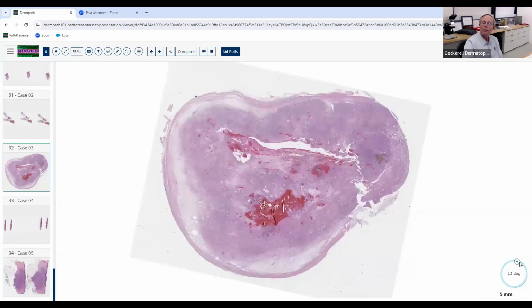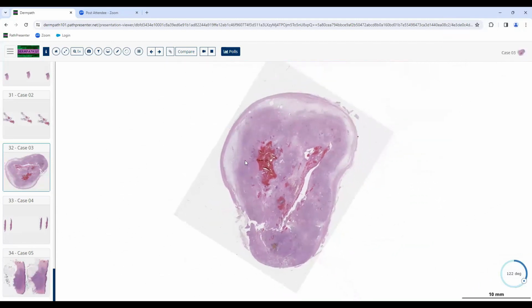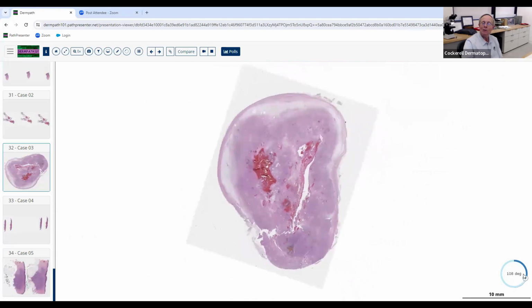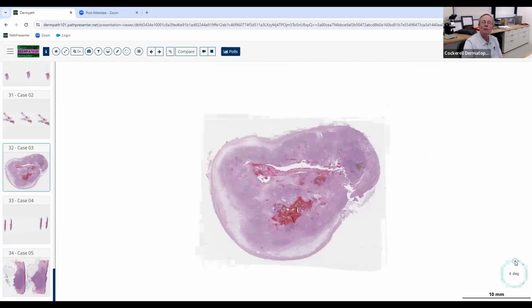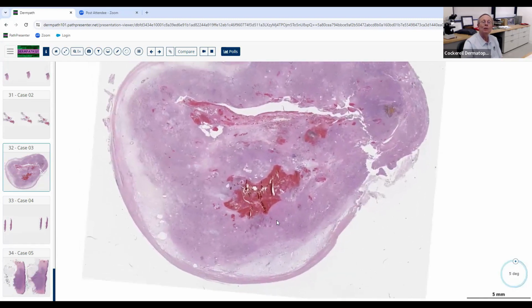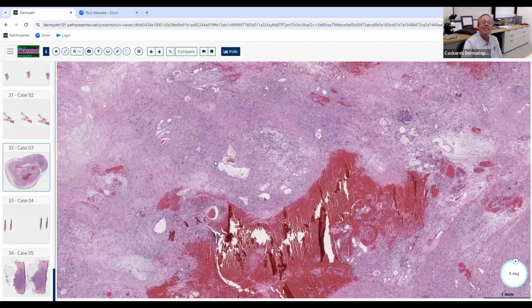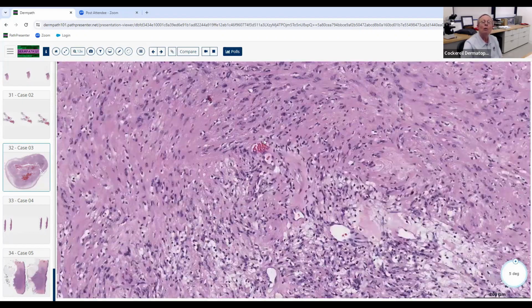Let's turn it this way too for interest. Yeah, so I was going to turn my head that way. Looks like a little face almost. Yeah, kind of looks like a skull. Okay, so at our magnification, we sort of favor benign. Let's see if we can tell what kind of differentiation we're dealing with. We're not sure at this power yet. Got a lot of big vascular areas in it. Maybe it's hemorrhage into the lesion. Let's get on the higher magnification, see if we can tell what we're looking at here.